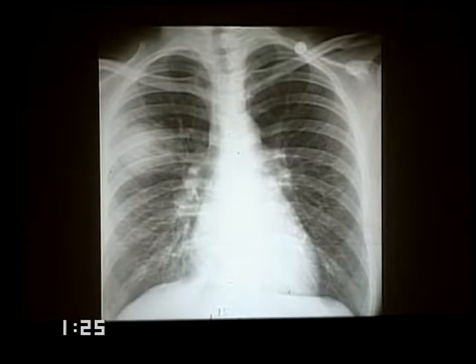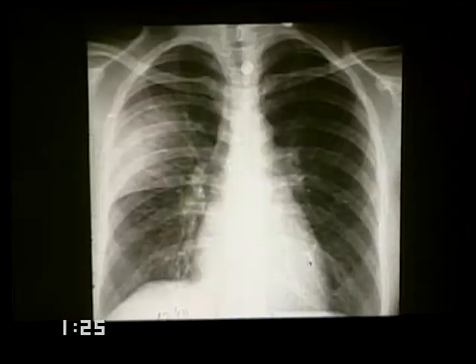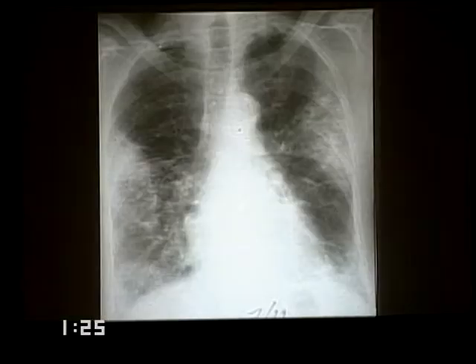There's a peripheral airspace abnormality at 1 in the morning, and approximately 12 hours later, one can see, this is the slide I showed you earlier, it is extending centrally. It is very uncommon nowadays to find lobar pneumonias. Usually these pneumonias are aborted pharmacologically before the entire lung consolidates. If you find a classic lobar pneumonia, you must strongly suspect that there is an underlying immune abnormality.